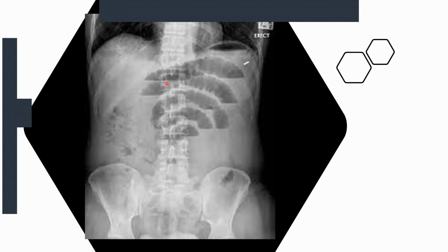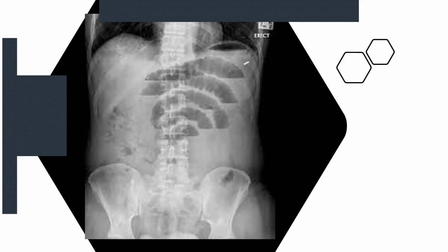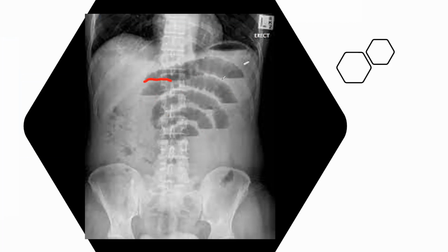Having discussed the patient with him, let's just put this here just so that you guys can see it quite easily. So here we can see all of the air fluid levels. There's quite a few, so with the patient now standing upright, these are all air fluid levels sitting over here. So remember, nature abhors a straight line. So anytime you see a straight line on an X-ray, it means that something is going wrong. So this is one of those cases, and he's got quite a few dilated loops of bowel.